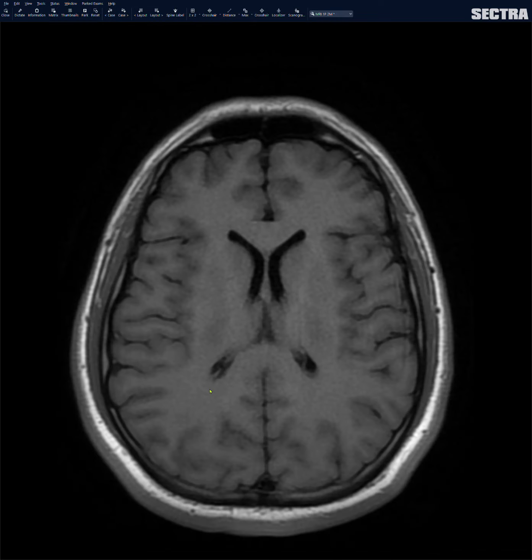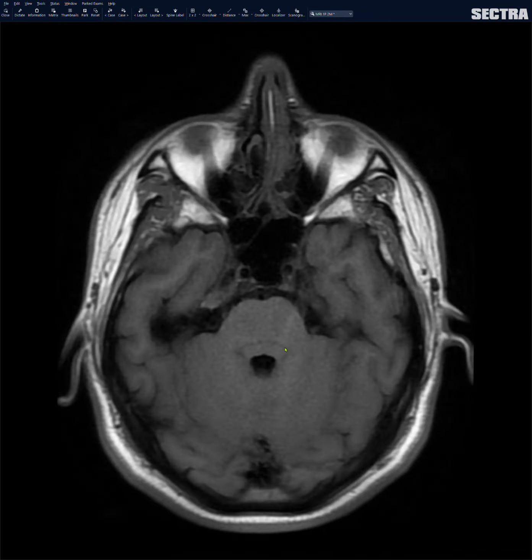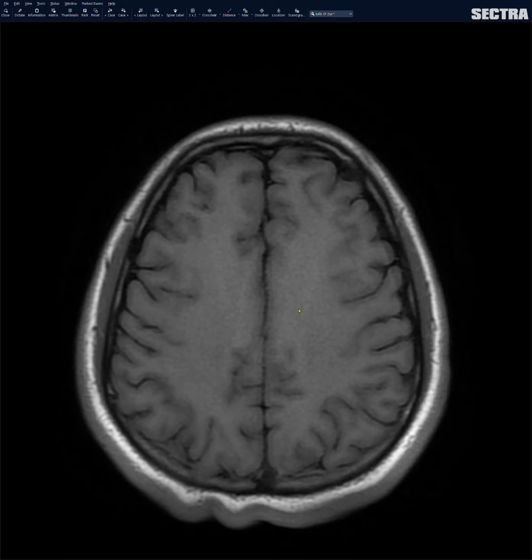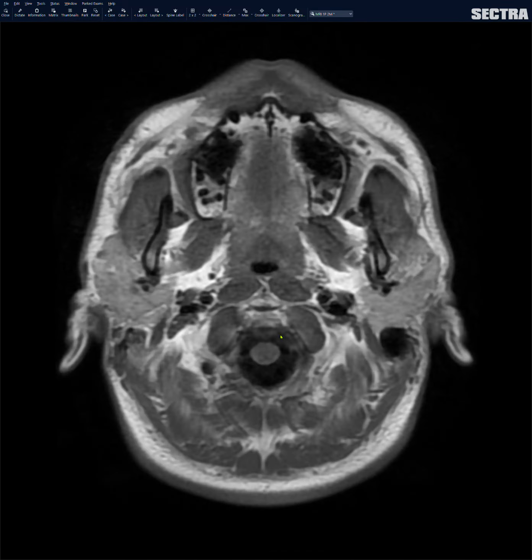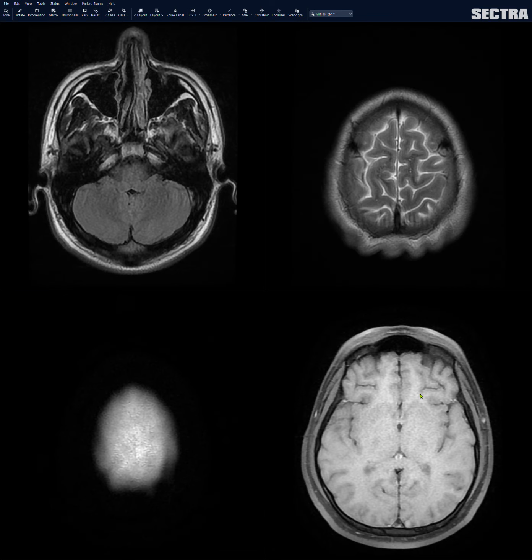All right, the T1 axial, usually I spend 2 seconds looking at it. I just scroll through and look for anything that's really bright. Things that can be bright on this T1 axial could be like a lipoma. Hemorrhage can also be bright. A little subdural can be bright. Intraparenchymal hematoma can be bright. Sometimes melanoma mets can also be bright too. But usually 99% of the time I just scroll through in 2 seconds.